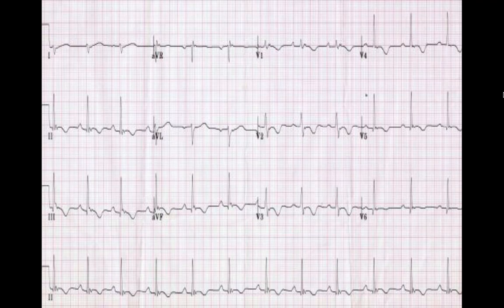Here we're looking at our normal 12 lead that we take on any patient, but looking at V1 through V3 we notice some abnormalities in that ST segment, especially in V1. We see a little hump, a bump, just an extra little fluctuation in there, and this is also associated with inverted T waves. You can see it in V1, V2, V3, pretty much through most of the precordials, but we definitely see our extra fluctuation in that ST segment.